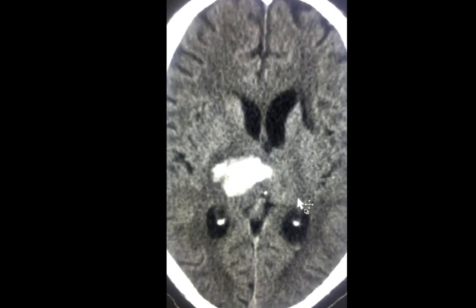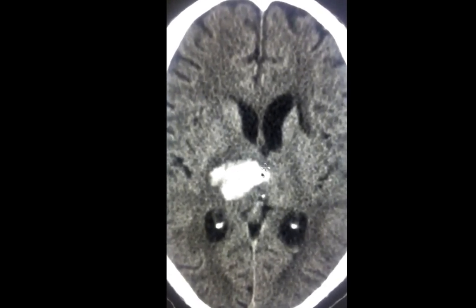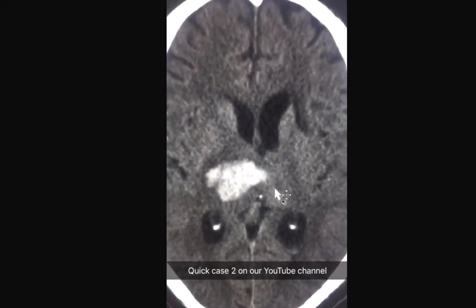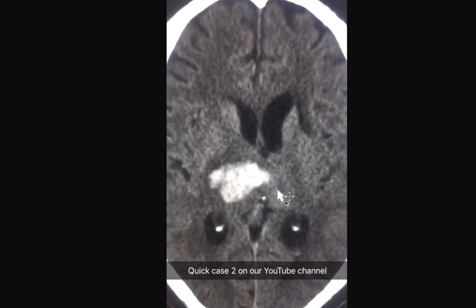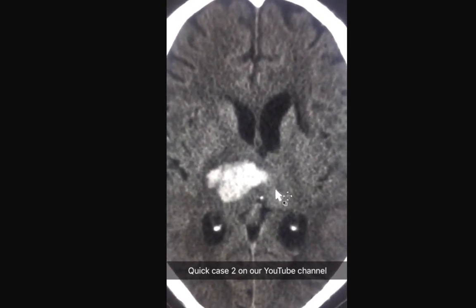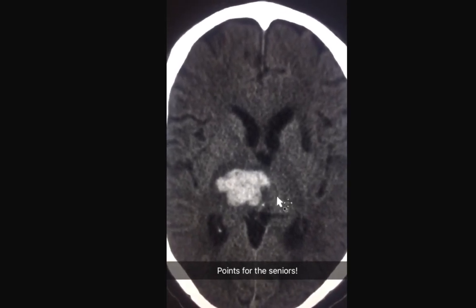Given the patient's known history of hypertension and acute presentation, this represents a hypertensive bleed. For a comprehensive differential diagnostic list for acute intraparenchymal brain hemorrhage, please visit our quick case number 2 on Radiology Bit's YouTube channel. Now let's give a few points for the senior residents.